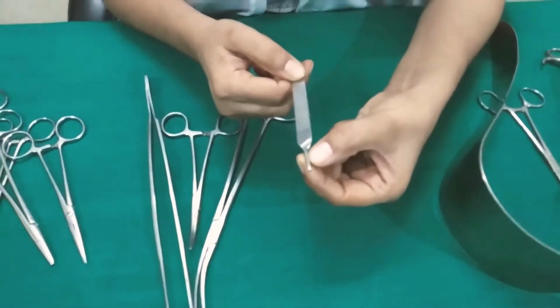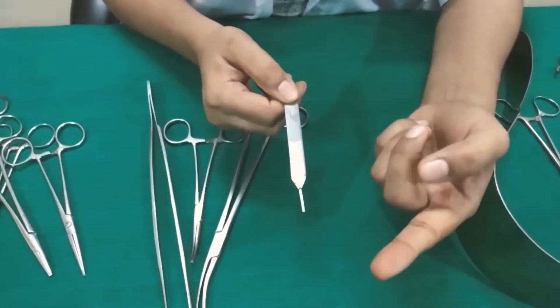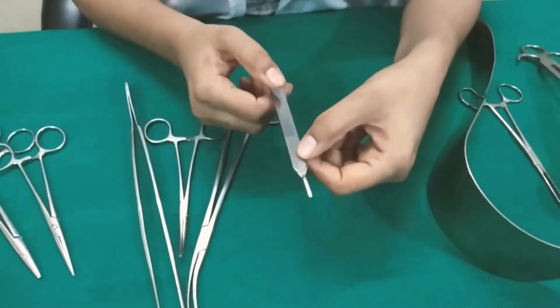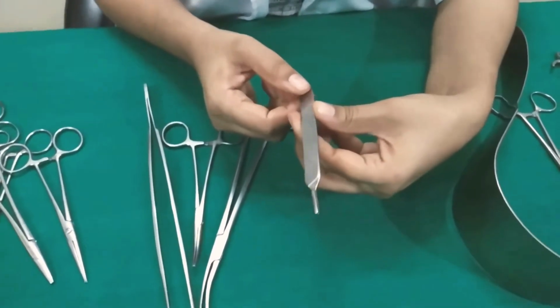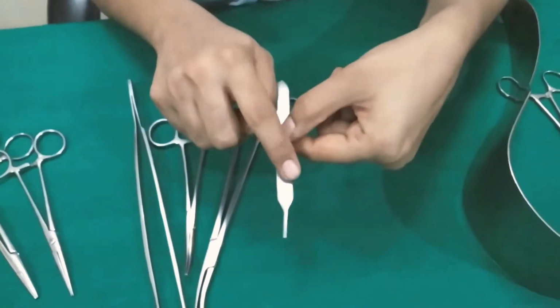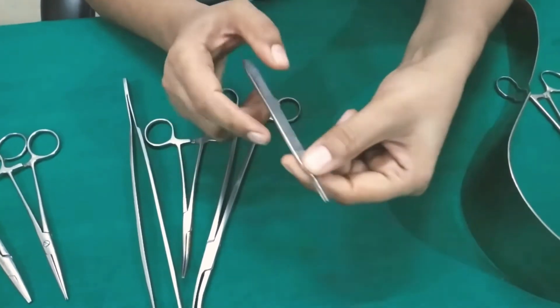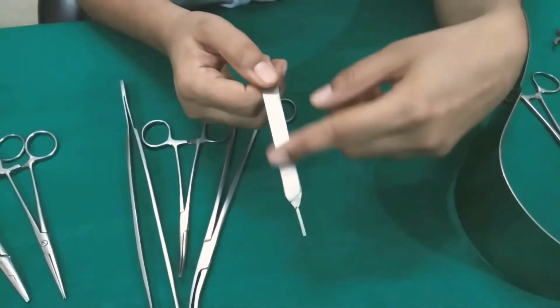Surgical blades are usually disposable, and there are 10 to 20 in number, and various sizes are available. This instrument has a shaft, and it has many serrations to prevent slipping and for better gripping. Usually these handles come in numbers 3, 4 and 5, and usually we use the number 4 handle.